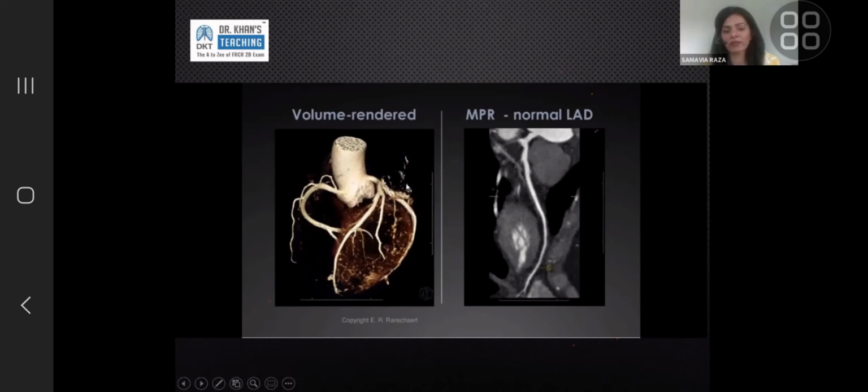But the image we use is the MPR in the longitudinal way, and what that shows is an MPR through a normal left anterior descending artery. And you will be able to appreciate images there, but that's a single snapshot. That image is rotatable, so you will have to swing through that vessel to see if there's any plaque hiding elsewhere. You cannot quantify the degree of stenosis based on what that image looks like.